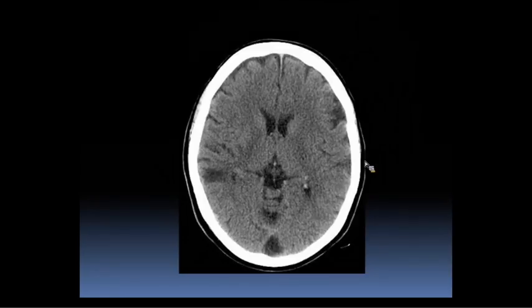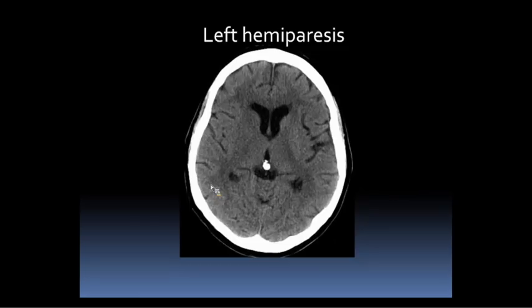Okay, this is just an example of a small acute infarct somewhere else where we just have hypodensity involving the cortex and subcortical white matter, loss of gray white differentiation, similar to the insular ribbon sign, but can be anywhere. And something peripheral like this is probably due to embolus or something like that.